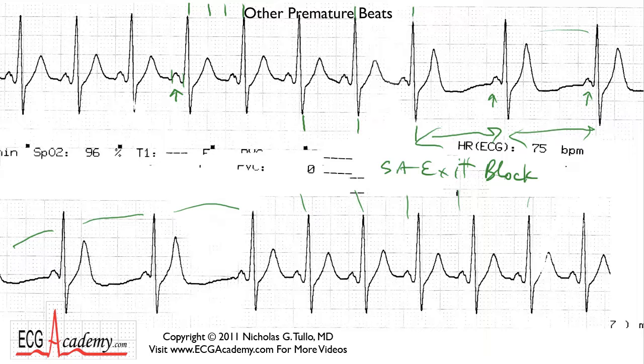And again, the key is in the T waves. Look at these T waves. They look very smooth and very consistent, and then suddenly, this is Mount Fuji over here. Why is it so tall? And why is it followed by slowing of the ventricular rate? Well, that's because right here is a P wave that did not get down the AV node.